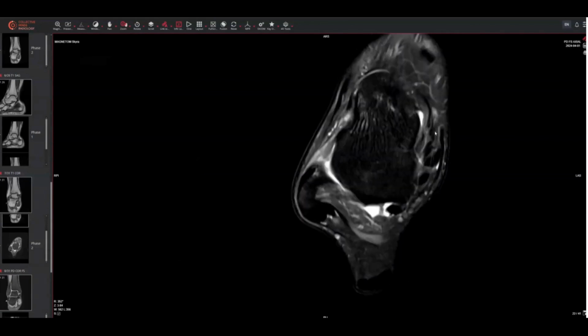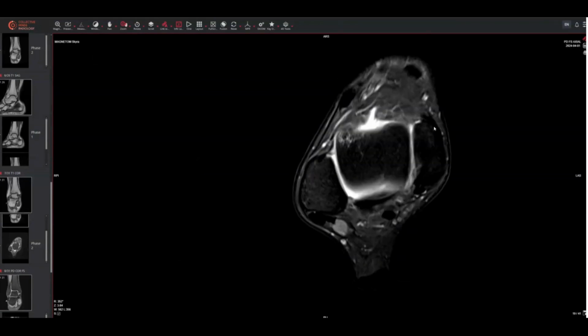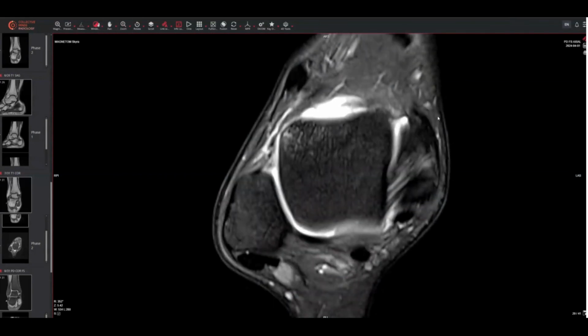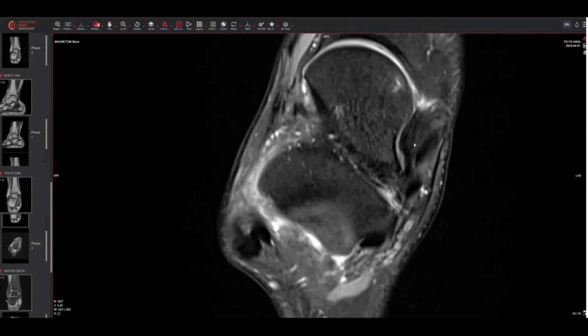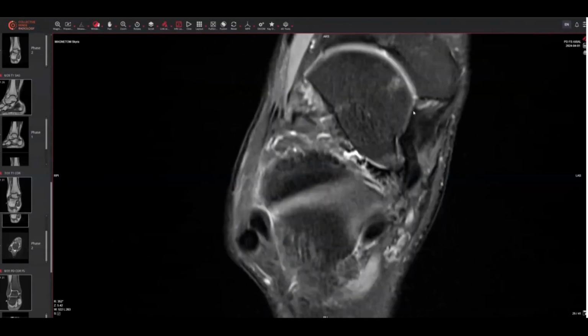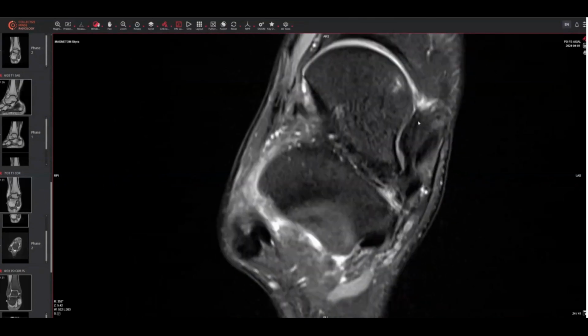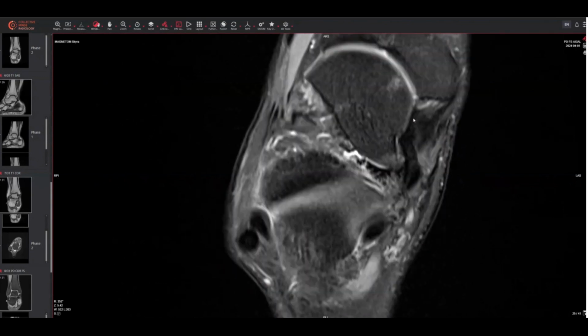Let's go back to our deltoid ligament here, appreciating the sprain of the posterior deep deltoid, appreciating the superficial deltoid seen here. Let's window that a little bit better. And the anteromedial band here, we can see our tibiospring ligament sprain in this location as it gets down to the spring ligament. This is the superomedial band. The superomedial band of the spring ligament has real estate. Anteriorly, the band of the anterior superficial deltoid, that tibionavicular band goes here.